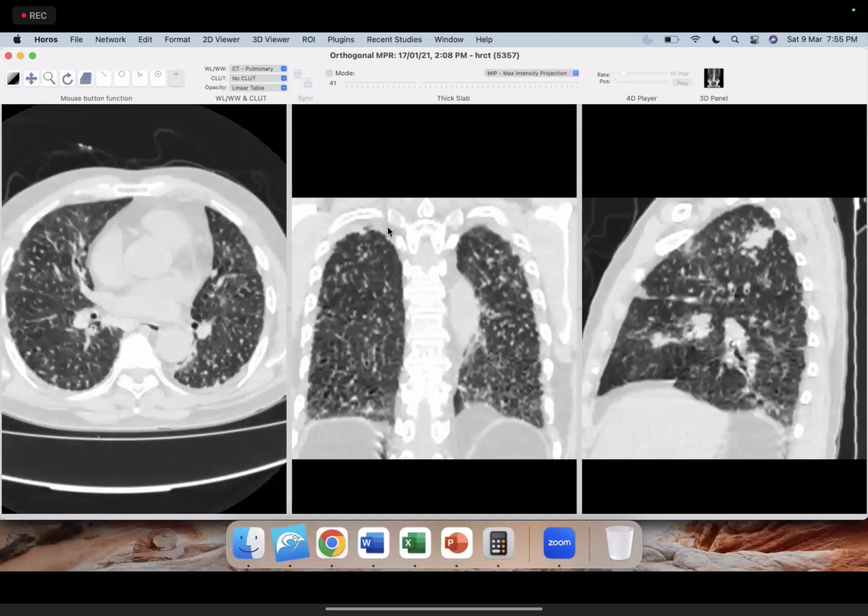How to differentiate from TB? Differentiate what? I don't think with these nodules that TB should be a problem because TB is a focal confluent involvement, not diffuse symmetrical bilateral like this, and the branching pattern, etc., and other signs like necrotic nodes or effusion, etc.